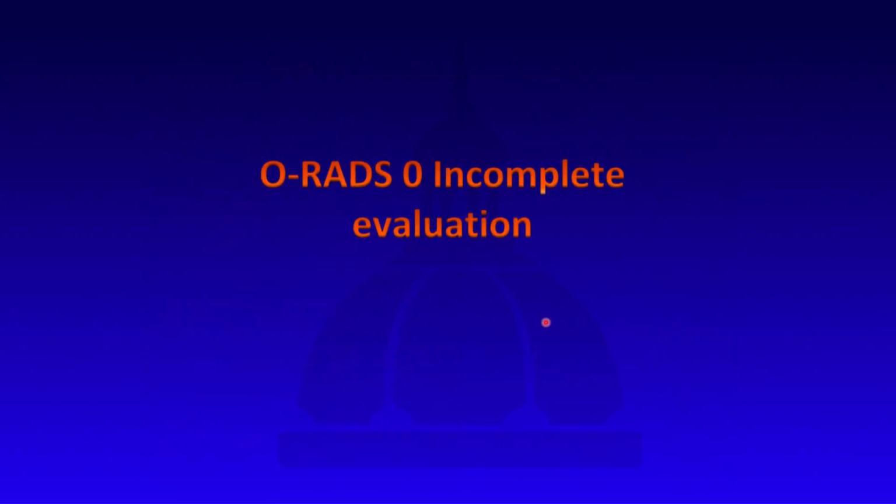So O-RADS 0 is incomplete evaluation, and basically it depends on what you're dealing with. It's incidental. The patient is an 80-year-old lady, I don't know why they do a pelvic ultrasound. You don't see the ovaries. But if the patient comes for a palpable adnexal mass or something like that, and you don't see it, then you should put O-RADS 0 because maybe this patient needs another examination like an MRI.